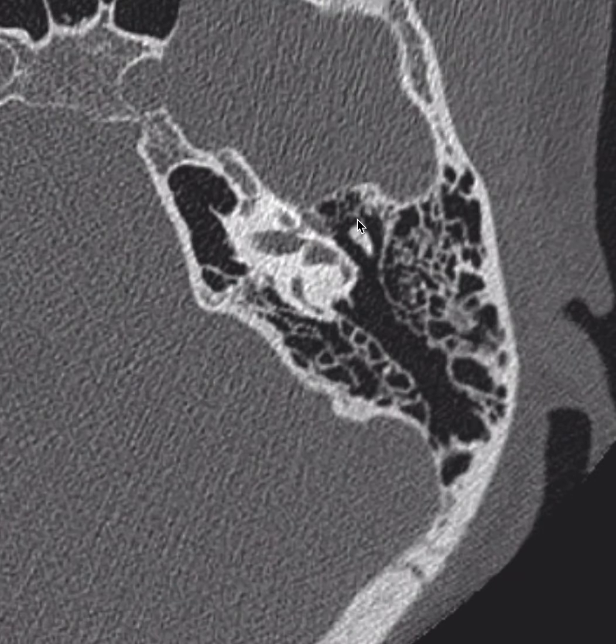Now I mentioned a subspace of the epitympanum called the anterior epitympanic recess. That is right here, anterior. Specifically, it is anterior to this bone, which is coronally oriented here, called the cog, C-O-G. The cog separates this space and is of significance because if pathology gets through here, it can be particularly hard to reach. You'll specifically need a middle fossa craniotomy in order to get to lesions in this area.